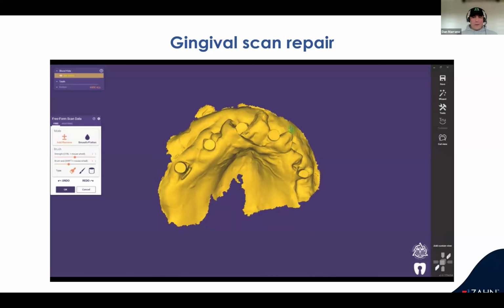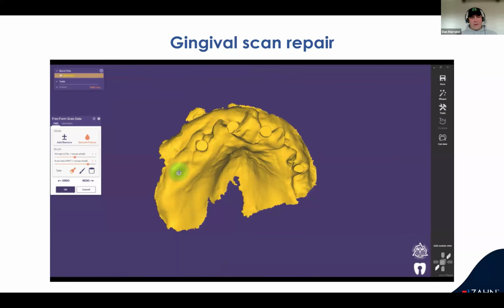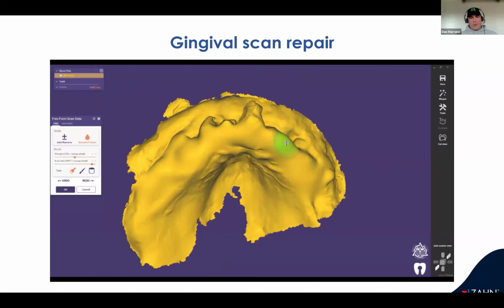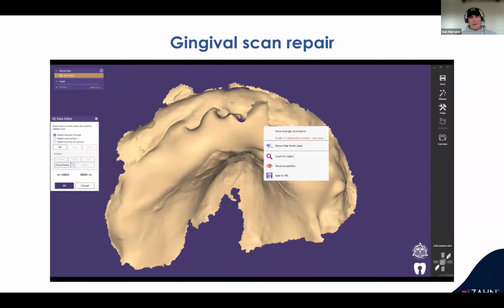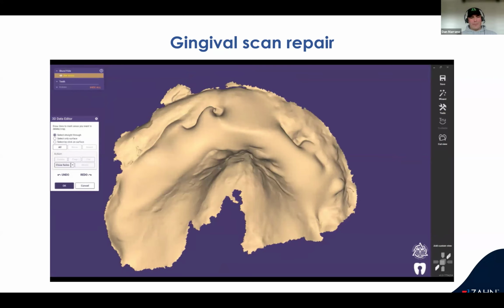And here's one. I slowed this one down. You see there's artifacts there. As you rotate, you'll see they glisten. As I did the super power smoother here, I realized that it's actually a huge hole right there. Again, I'm not asking anybody to rescan this stuff.